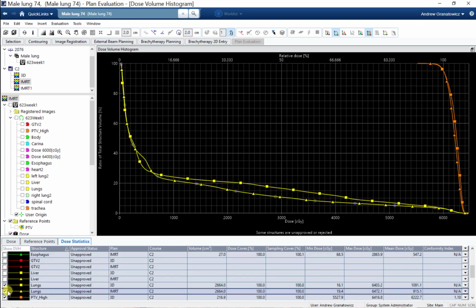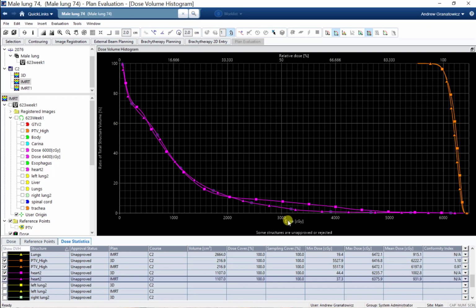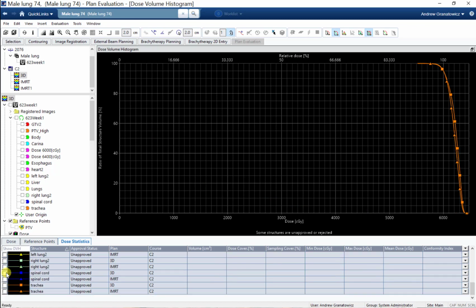If we look at lungs, IMRT is better. IMRT is just able to get more conformal than we were able to get with our 3D plan, so that our V20 is about 5% lower. That is probably statistically significant, right? So that is a big improvement. But is our 3D still very much meeting normal tissue constraints? Absolutely. We were probably less than 1% away from getting it lower than 20%. We probably could do that with 3D if we tweaked it a little bit more. Heart, again, they're right on top of each other, not much difference there. Cord, again, about the same.